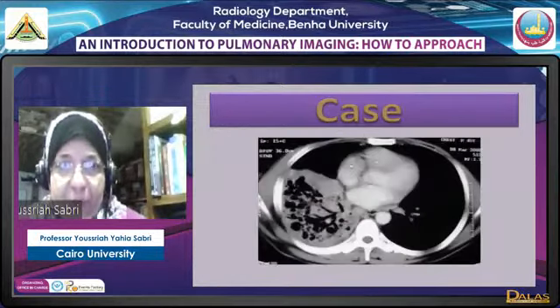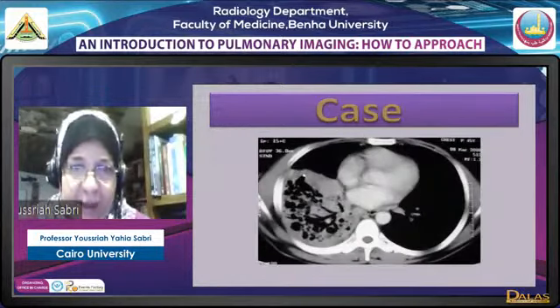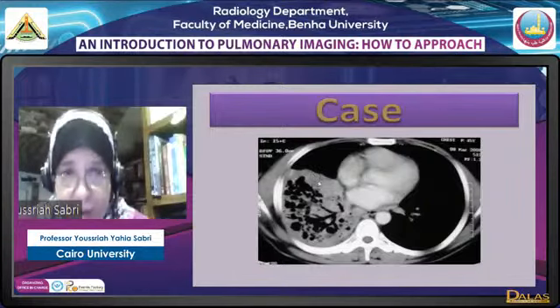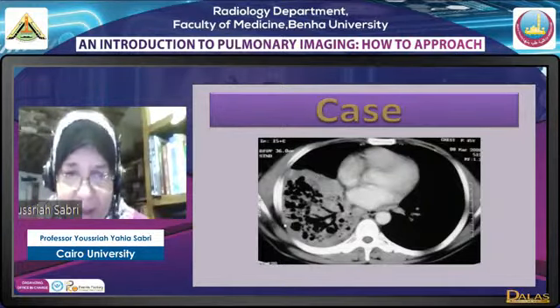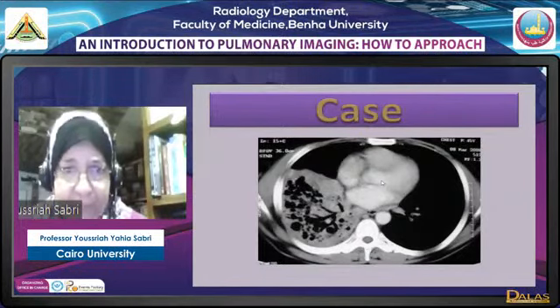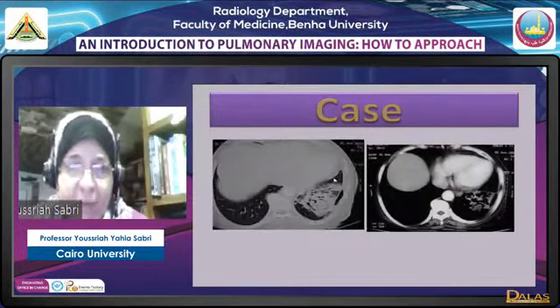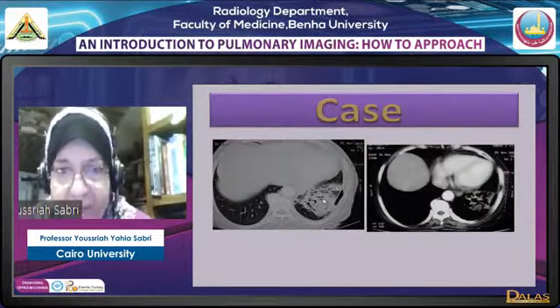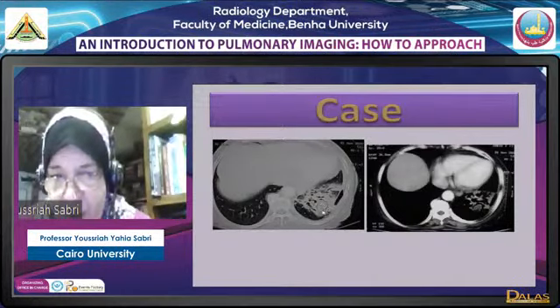Okay. Now, this is a CT, and here we have solidification of the right lower lobe, meaning we have consolidation with cavitations, as you can see, and with air bronchogram. This is a pneumonia. In this case, we have a complicated case of pneumonia. We have partial consolidation of the left lower lobe, but it is associated here by a cavity with a mycetoma inside.